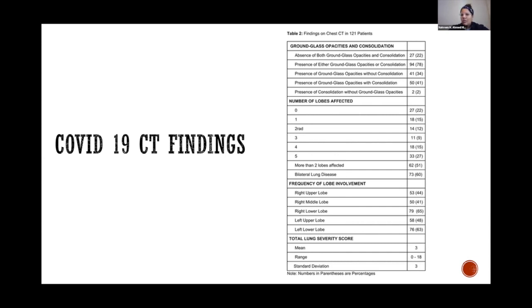The next question everybody asks is, well, what if I can't turn the patient over? What if I'm unable to access their posterior lung zones? Kind of do the best that you can. If you have an extra set of hands in the room, you can have them help you log roll the patient a little bit to get a view of the base. But whatever you can do in the resources that you have is the best thing to do to really understand the pathology of the patient.